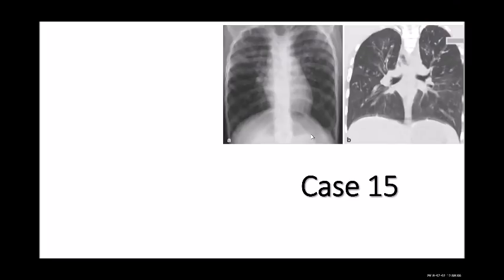No, don't give me differential diagnosis. This is a centralized X-ray. It is a hyperinflated chest. Hyperinflated chest, I agree with you. How do you know it's hyperinflated? Can you tell me? Because by counting the ribs and the flattening of the diaphragm. How many ribs you counted? Here we are counting 1, 2, 3, 4, 5, 6, 7, 8, 9. More than 9.